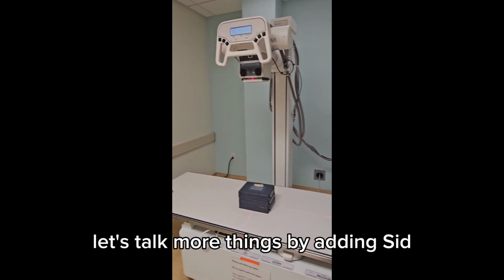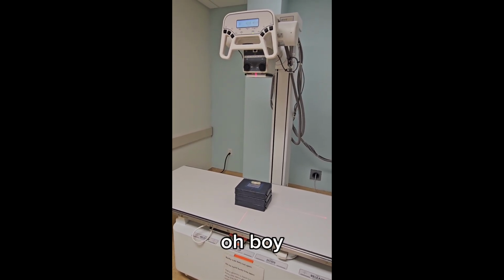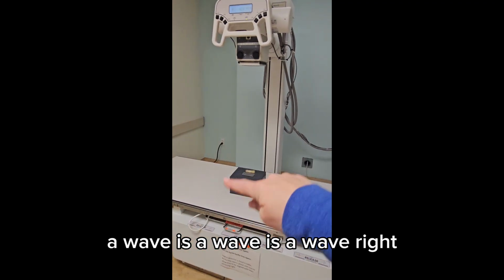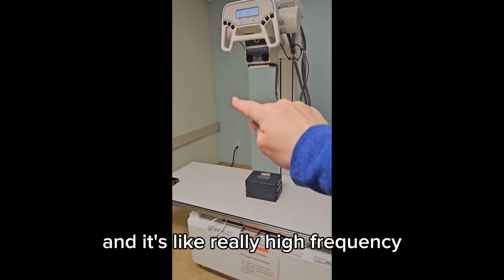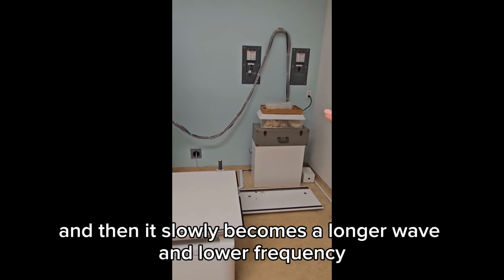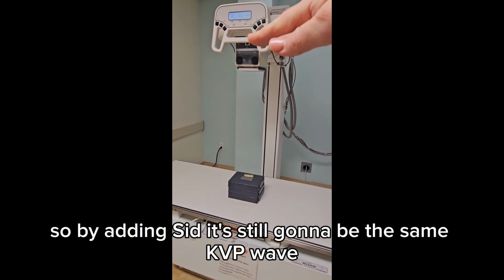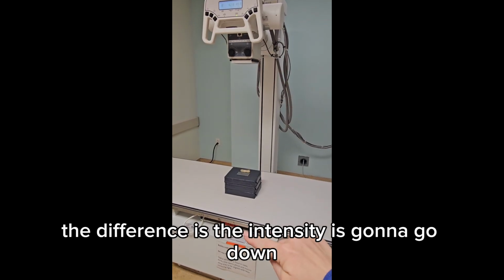Let's talk more things. By adding SID, what's going to happen to contrast? Oh boy. Okay, so this is where I usually lose people, right? By backing up SID, there is no change in contrast. A wave is a wave is a wave, right? So I picture the KVP wave. It's not like I ever have the wave and it's like really high frequency, short wave, and then it slowly becomes a longer wave and lower frequency. The KVP wave is still the KVP wave. So by adding SID, it's still going to be the same KVP wave. It's still going to be the same contrast. The difference is the intensity is going to go down.